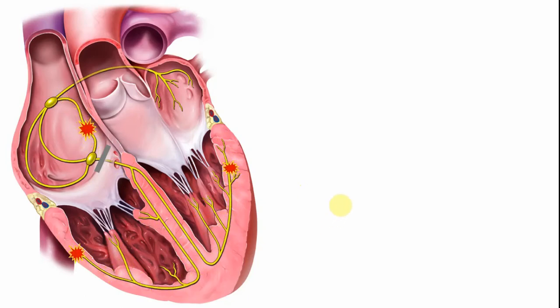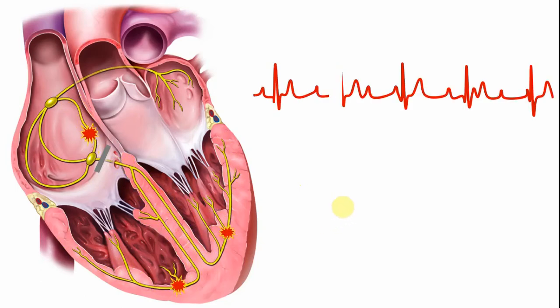No relationship between the P wave and the QRS complex, and that is all about a complete heart block. Let me show you what happens to the ECG once again. So in this particular ECG, the same ECG that I have shown in the very first slide, there is a P wave, which is normal morphology, which is great. Then there is a QRS complex because of the depolarization that is generated from here, and this P wave is because of the cardiac impulse that is generated from the SA node.